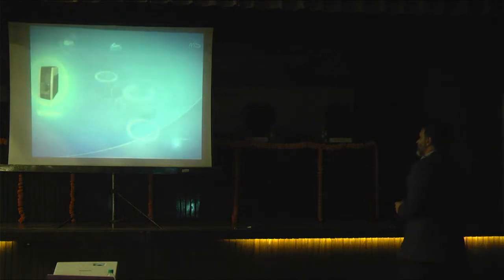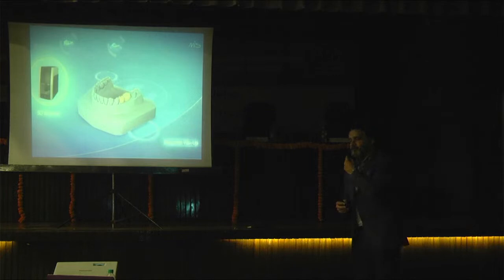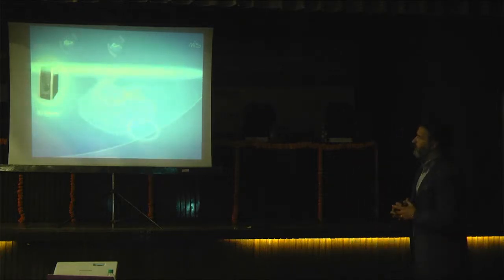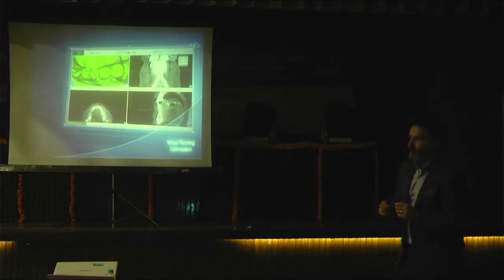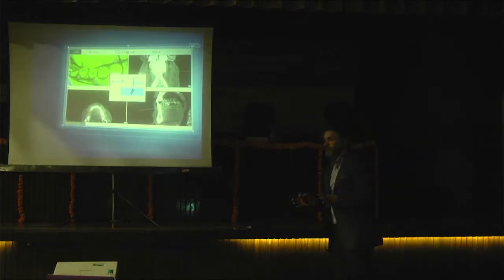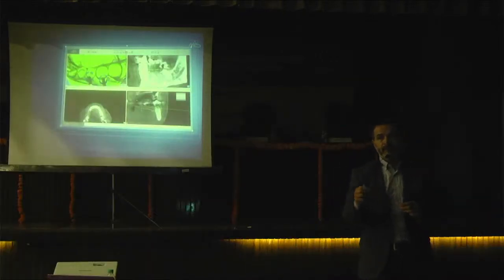With the 3D scanner, we get the STL files and put them on MSoft, along with the other files from the patient, from the model, and the wax-up of the final prosthesis. This is our goal, and after it we match the DICOM and STL data, and then on MSoft we start planning the procedure. We start planning the implants.